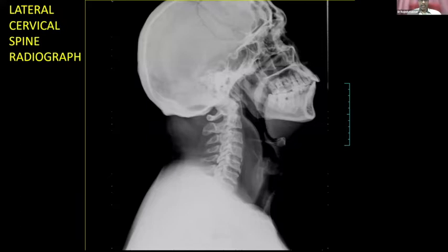Okay, fine. So what do you think could be the cause for this? The soft tissue I'm able to see looks a bit darker than the muscle, sir. What are the common causes of prevertebral soft tissue widening? Sir, it could be a retropharyngeal abscess, or a retropharyngeal hematoma. Then it can be lymphoma.